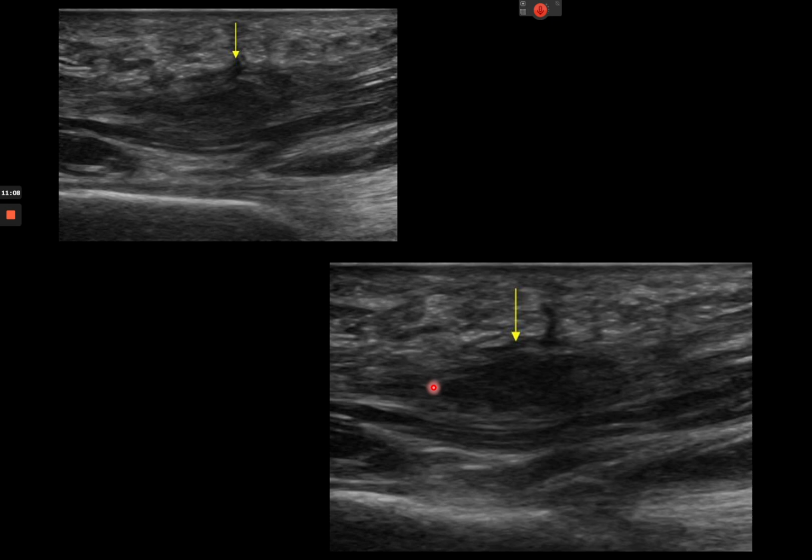If you think about a continuation of degenerative change in the fascia, where it continually gets more frayed, those intrasubstance tears become larger, and then we get towards the end, we start to get a decent split that forms. So it's more of a continuation. It's different to someone who's healthy, young, nice looking plantar fascia, acute injury where it ruptures.